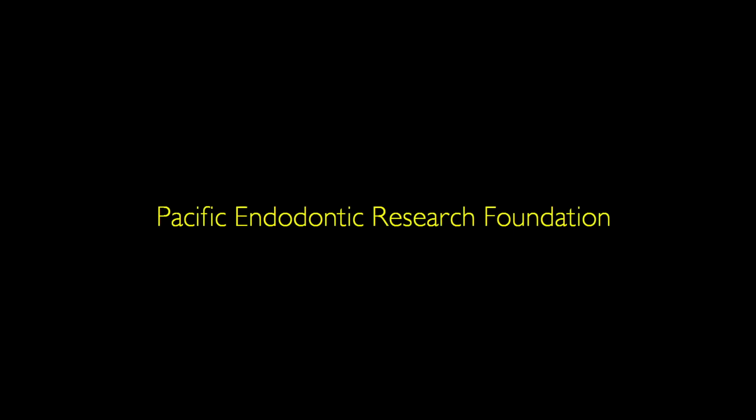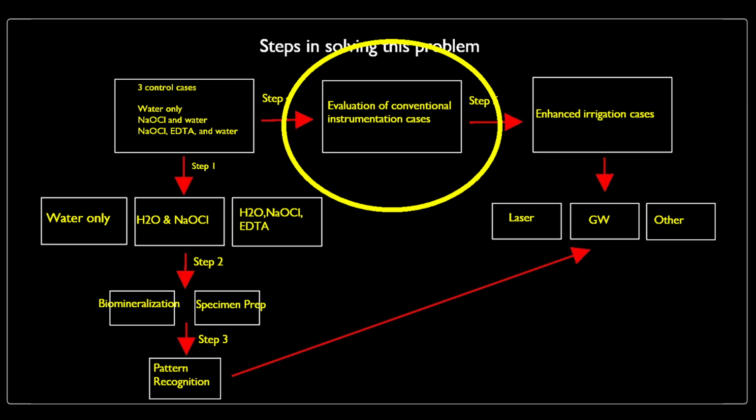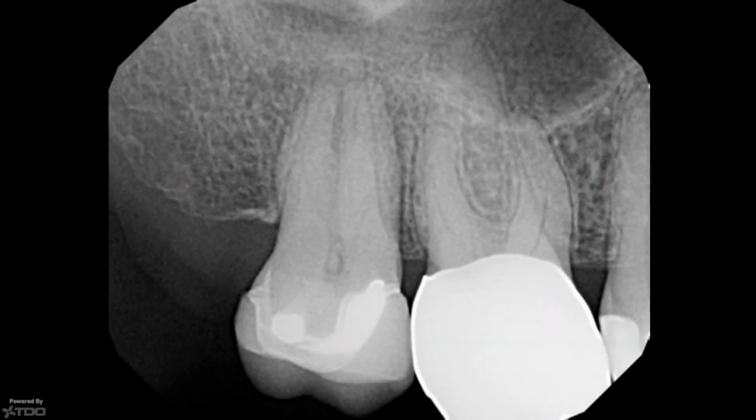These next two videos will review Pushpak's conventional instrumentation cases. We'll take one case at a time. As the flow diagram shows, we're going to do this before looking at any enhanced irrigation cases. This is Pushpak's case, a maxillary second molar.